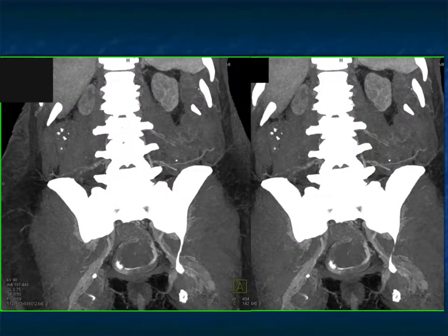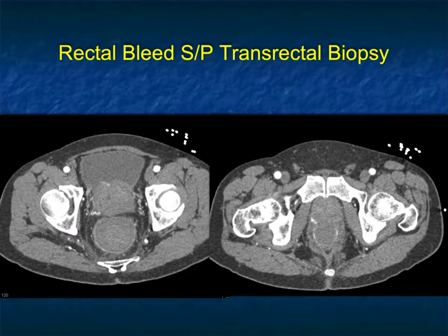And again, some MIP imaging. You can see the importance of the volume rendering, the cinematic rendering, and the MIP imaging. Now, sometimes you could say, well, maybe it's overkill. Showing it to me 6 different ways doesn't matter. It's one correct way that matters, and that indeed is true. But sometimes it's these reconstructions that allow you to be certain as to the presence of blood, the site of bleeding, and the precise cause.